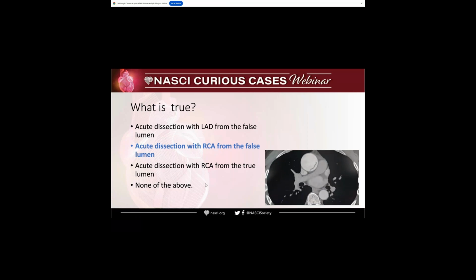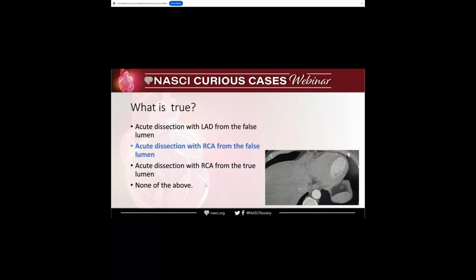Okay, so always think when you evaluate the scan, which phase am I in. It's not just the location, it's also the timing that we scan the patient. Just like in other parts of the body, for example, the liver, if you have a hemangioma, it will look different in every phase. And that's why, because it changes over time.